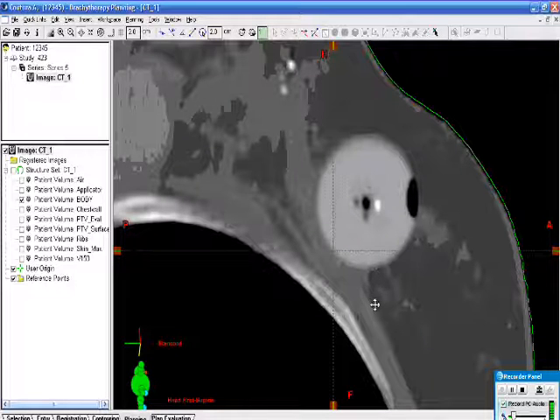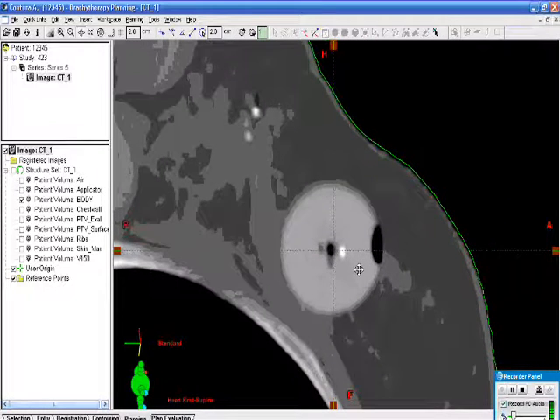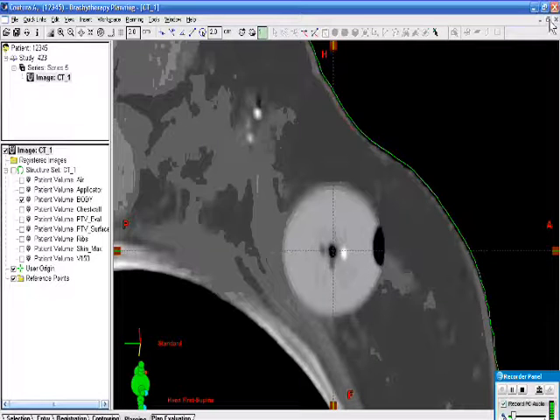That's channel number 1. Now, that'll tell you where channel number 1 is, but you don't know necessarily whether your view is looking toward or away from the entry side of this balloon, so you don't know which way around is channel number 2. So the current thinking on this is to place an external marker into channel 2, and that's what you see here. This is a solid wire marker that someone has placed into channel number 2. So we know this is channel 1, this is channel 2, and by elimination this is 3, 4, and number 5 is in the center. So I'll move this back to the center again, and we'll go back to where we were of setting up the views.